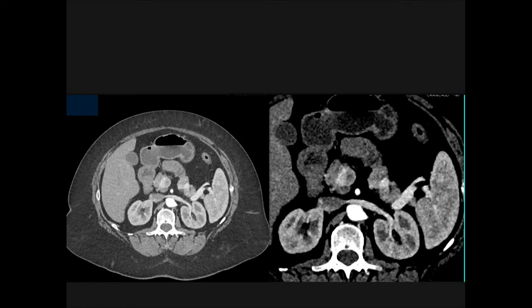And neuroendocrine tumor is D. That could be the correct answer, but I said the best answer. Hypoglycemia, the best answer is this is a neuroendocrine tumor, which is specifically an insulinoma. Just a very nice example.